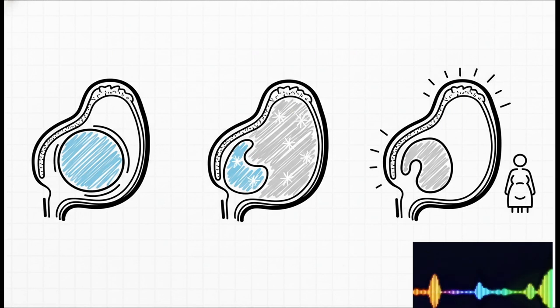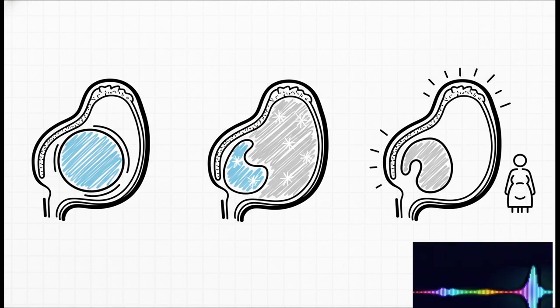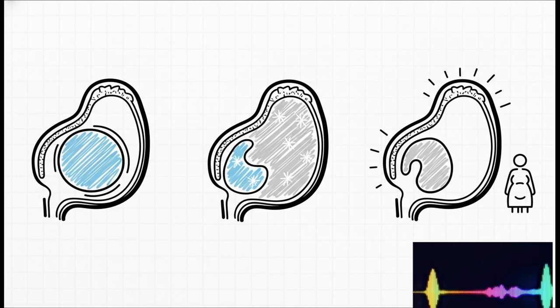Now, it's super important to remember, not every lump and bump in the sella is an adenoma. You've got to keep your differential diagnosis wide open. You could be looking at a Rathke's cleft cyst, which is often cystic, or maybe a craniopharyngioma, which can have both cystic bits and calcification. And you have to be on the lookout for inflammatory conditions that can fool you. Things like lymphocytic hypophysitis, which is inflammatory and often pops up in postpartum women, or even rarer stuff like histiocytosis or granulomatosis. These can look like tumors, but they're something else entirely.